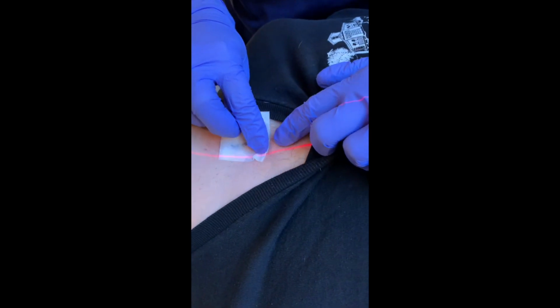The therapy team may try other ways to avoid re-tattooing you and may ask you to leave a Tegaderm on throughout your treatment covering that mark.